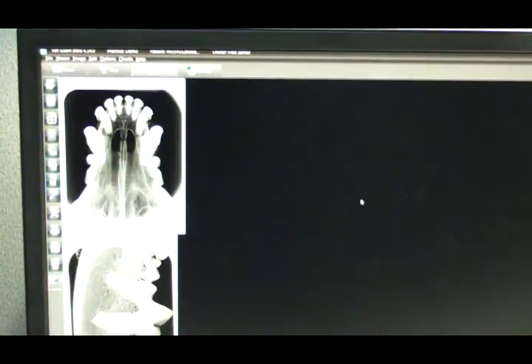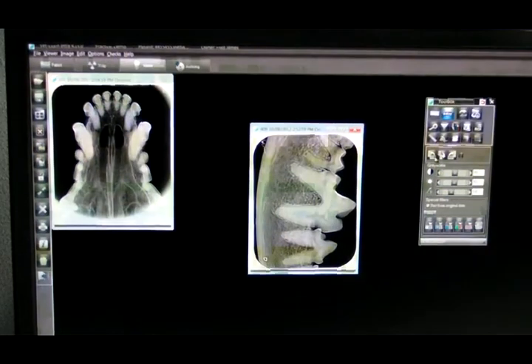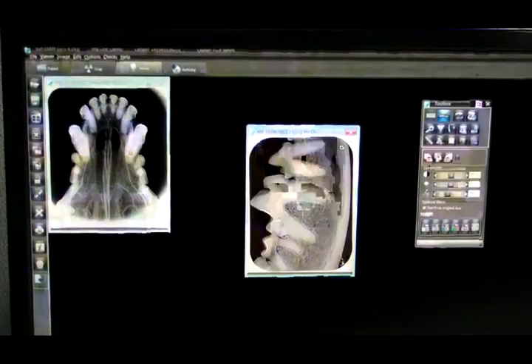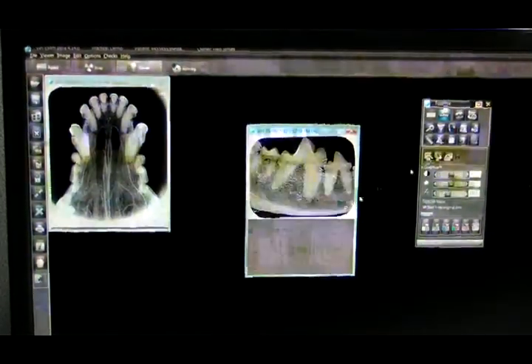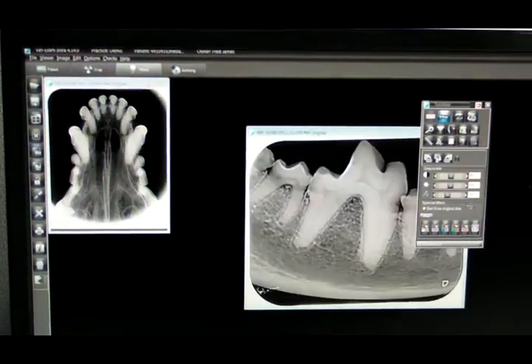It is a Windows program, so you can move around manually, or you can use Viewer, Tile, and that puts them on the screen. To rotate this image, double click opens up the toolbox, and then you have the chance of rotating. Hold the corner, brings the box to the size that you require.